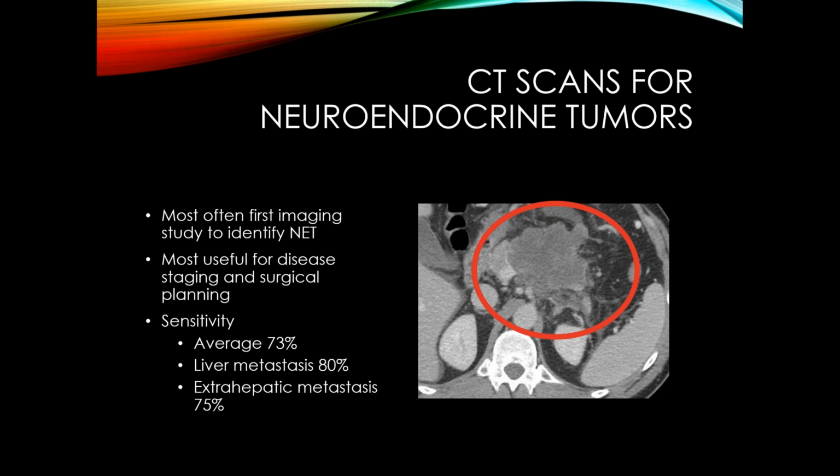So in terms of the CT scan, it offers valuable information. It tells you where the tumor is and what that tumor is doing to the nearby structures. For example, here's a pancreatic mass, and we can see that it's starting to go into the adjacent blood vessels. Now, that's important information for the surgeon to know how much they can resect or if they can resect it at all. It also tells us whether or not the tumor is spreading to the nearby mesentery or omentum and what it's doing to the other structures.